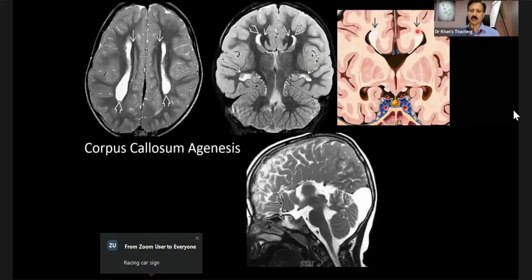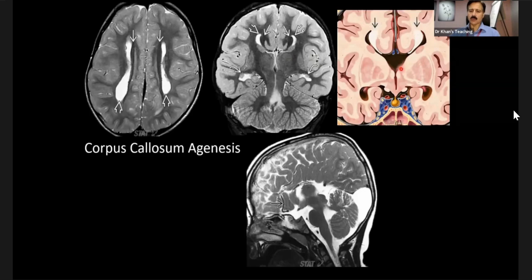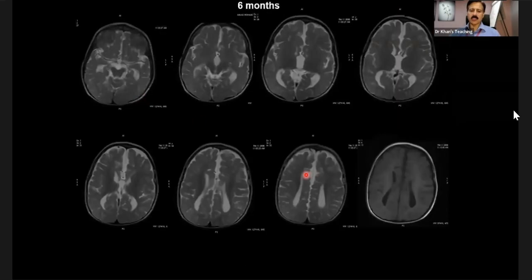These are longitudinally oriented white matter tracts. There is upward displacement of the third ventricle, and this is that moose head or Viking head appearance, which you can also see here, but nobody is going to show you. You have to develop your eyes on an axial slice. Nobody is going to show you a sagittal, but you can ask for a sagittal once you pick up on an axial. And if you see here, these were parallel.